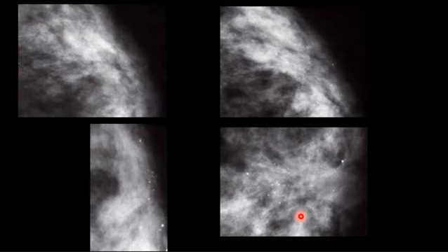So the comparison of the mammographic images done 1 year before, 2 years before, 3 years before, 4 years before, you have to compare all of them to get the final opinion. Okay? You need to have the whole file of the patient. The new one is not enough. If you just read this mammogram, it's not enough. You need a follow-up. Okay?